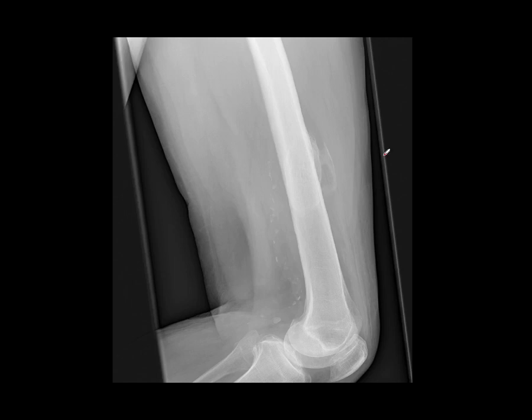It's due to bone formation in the soft tissues. In a way, it's similar to osteosarcoma, but it's a benign condition, and it's usually seen post-trauma. The reason I mention its similarity to osteosarcoma is because a biopsy of this area will show appearances very similar to osteosarcoma, and that's just something worth noting, so we must make sure not to biopsy it.